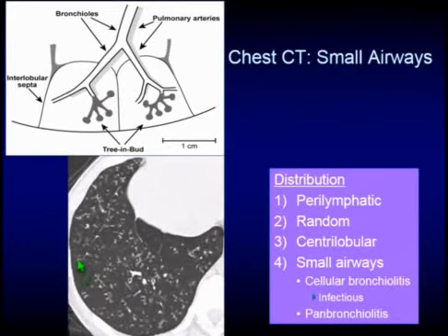Again, the lung is not homogeneously involved with these nodules, and none of the lymphatic structures are. We also see more centrally that the airways are quite thick, suggestive that this may be an airway process, which indeed it is. We also see a little hyperinflation, which may indicate air trapping.